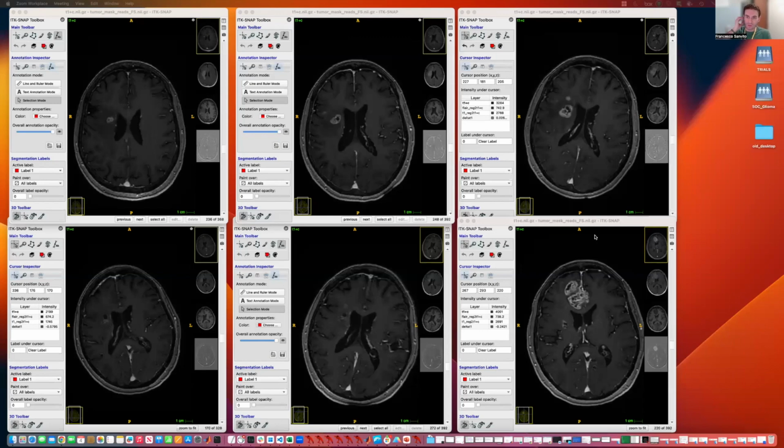Okay, in this video, I want to show the setup that I sometimes use for RANO reads for research projects. So as you can see, what I like to do is, if the study design allows for it, open up all of the time points that are available for the patient in a simultaneous reading presentation.